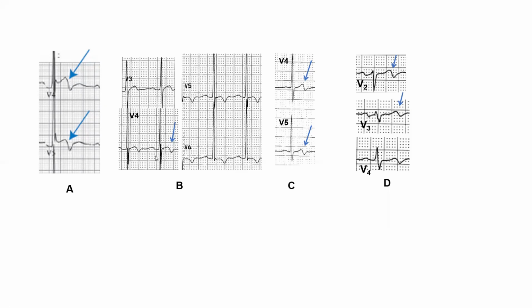So what happened, this is what we call the transition lead T wave. So you have LVH and you're going to have ST depression and particularly deep T inversion in leads V5, V6. On your way between upright T to negative T, you get a biphasic T wave in one lead typically. Again, this is T inversion of the transition lead. This is not Wellens.